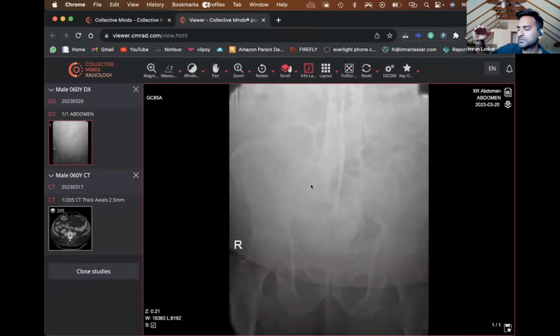So this is quite an important finding. What you don't want to do is see the collapse or consolidation and move on, right? The other signs give you the idea that there's more likely to be underlying infection or inflammation. Okay, so this next case is abdomen.